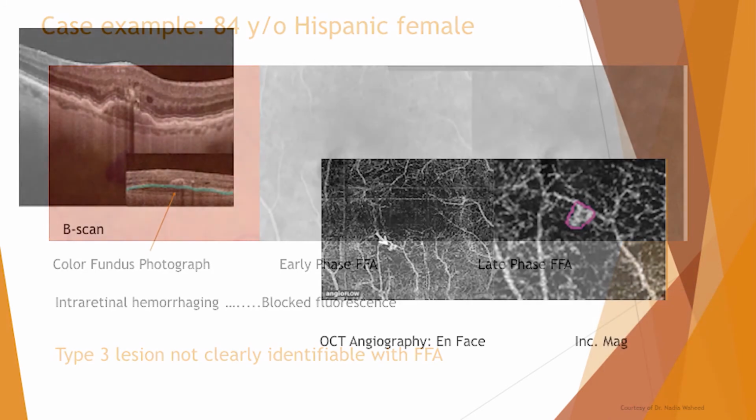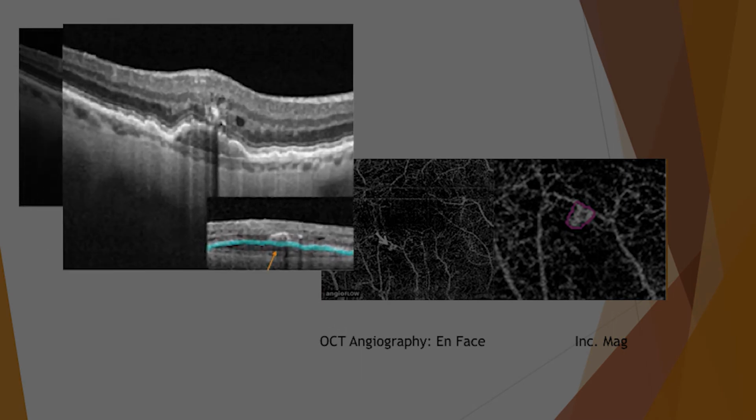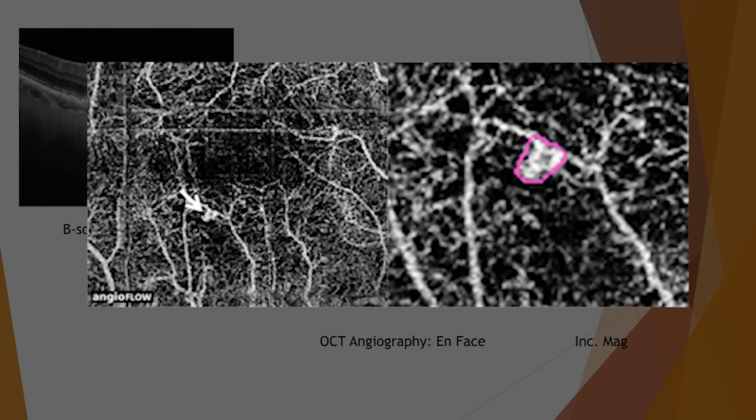Okay, so here, look at the B scan. Here, the PED looks more fibrovascular. It's not serous anymore, so this one's probably a stage 3. This one's crossed over the line, but look at that critical point again. Right above the PED is that hyperreflective bulb. You see that? That's the angiogenesis. That's the abnormal vasculature. When you look at the B scan, the blue line is running through the RPE. That's where my cut is on the angiography. Look at the highlighted bulb at the level of the deep retina. Pathognomonic for RAP.